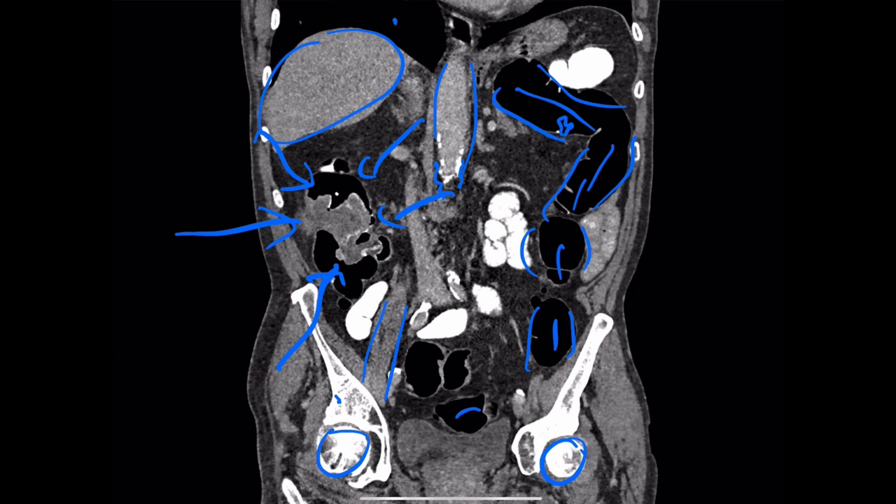As we look at it. And this is the small bowel or the left colon? No, this is the left colon. Left colon, gotcha. Lovely. There's a little bit of oral contrast, which we actually use to prep the colon, in the small bowel. And what are those dots? This is oral contrast within small bowel loops. Okay, so that's small bowel. Yeah. So we can actually differentiate that.